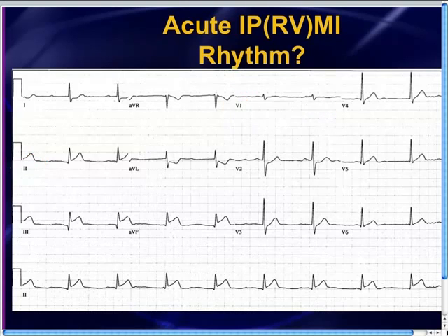But when you look at the lead 2 rhythm strip, you've got a whole rhythm strip down there to take a look at. There's some stuff going on. Stuff is another technical term here. Stuff going on, which makes you wonder that maybe there are some P waves after all. I'm looking down there at the rhythm strip and I see something there, and I'm just going to walk all the way across this. Hopefully you won't get bored of me for doing this.